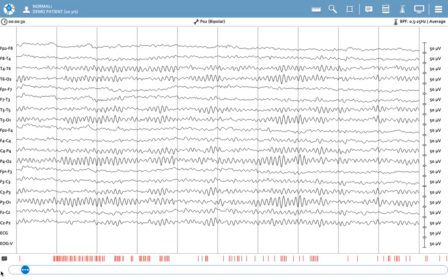Welcome to Clinical EEG, Part 1, the normal EEG of the adult. Shown is a 10-second epoch of a normal EEG, as typically assessed by a clinical neurophysiologist. Total duration of routine EEG recordings is typically about 20 minutes, and I will explain later about the various elements of such a recording.